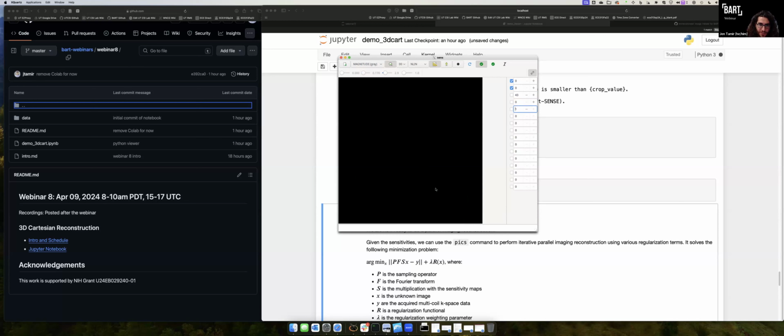I think though that for this particular data, there isn't much interesting stuff in there because this data was quite consistent. I guess the subject stayed still quite well. Can go here to absolute scaling just to check what's going on there.